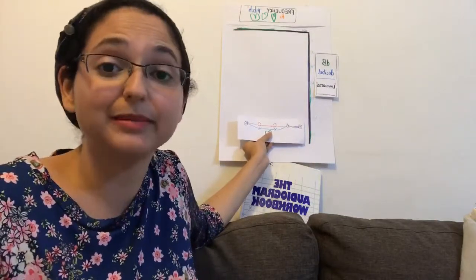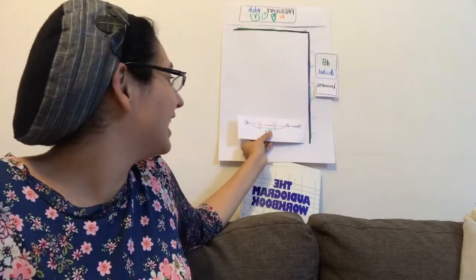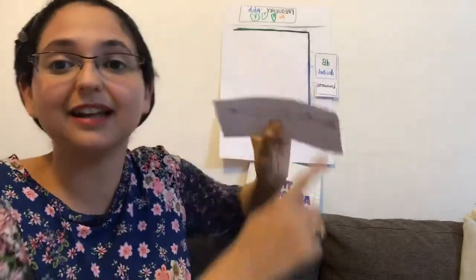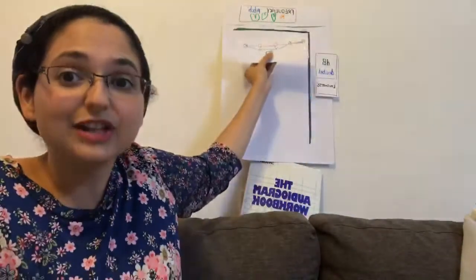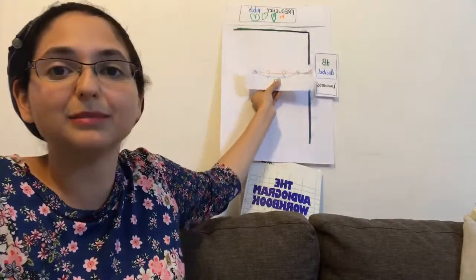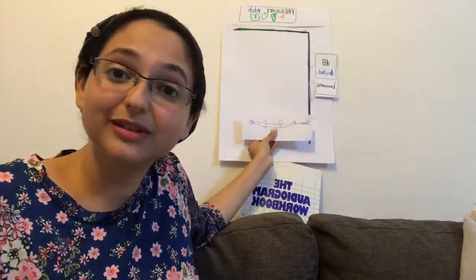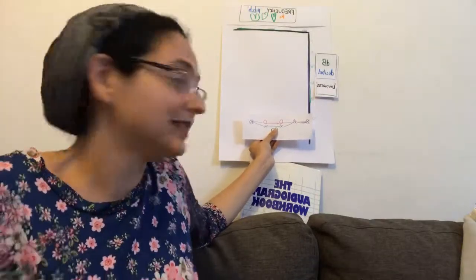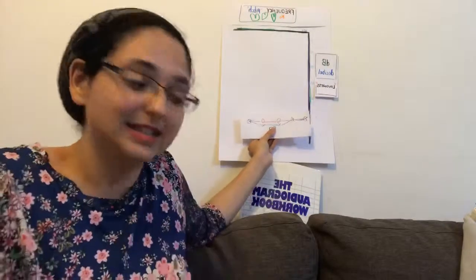It's sometimes referred to as deaf. And the other thing about this one is that they're all basically the same across all the different frequencies. So we're talking about degree. Is the degree normal, mild, moderately severe, severe, profound? But we need to also know another thing about the hearing loss. This one is flat. All the hearing loss at the different frequencies is the same.